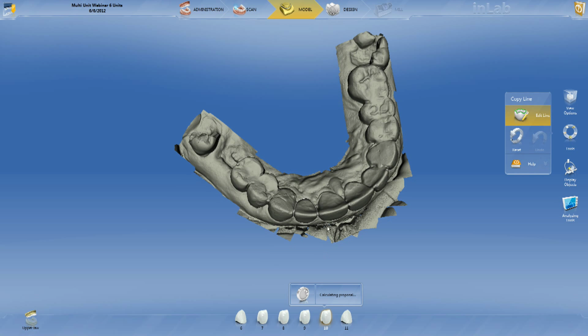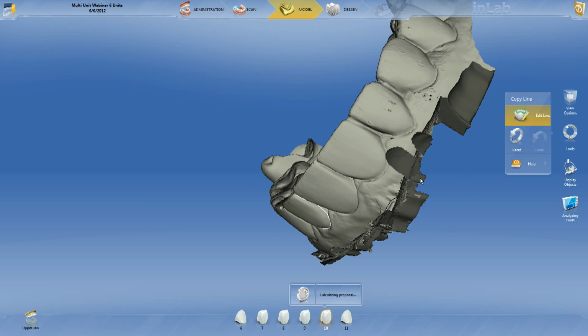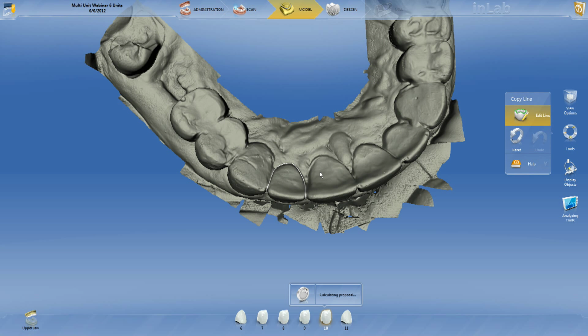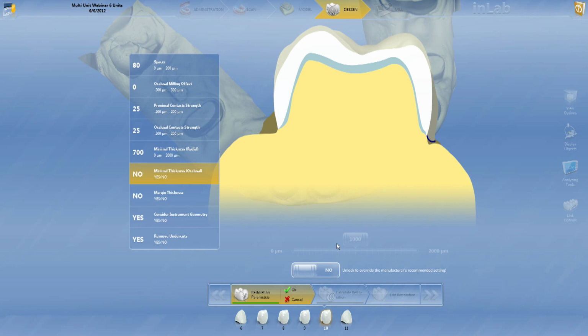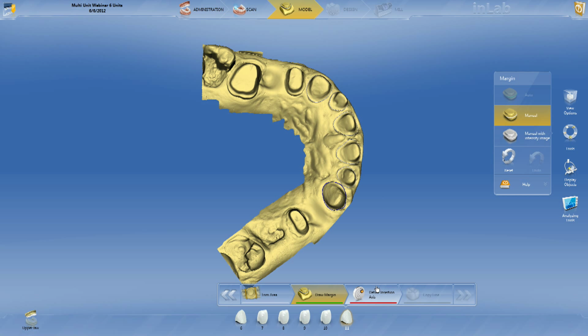All right. And those little marks are definitely going to show up in our biocopy. So hopefully we can hit on that real quick. Let's change it up. Let's work on 11. That will be our final.